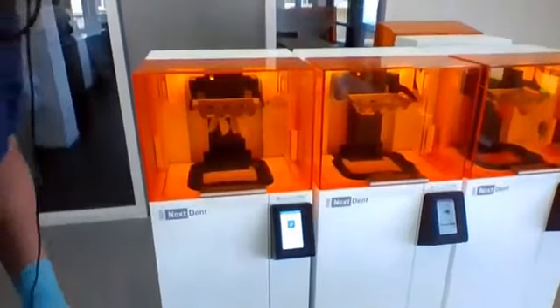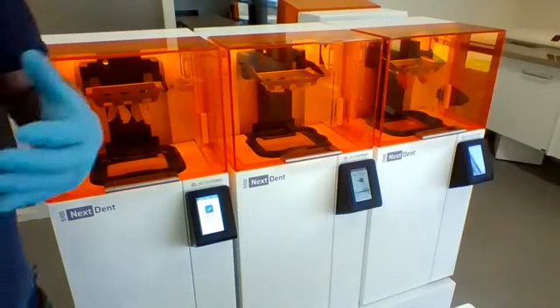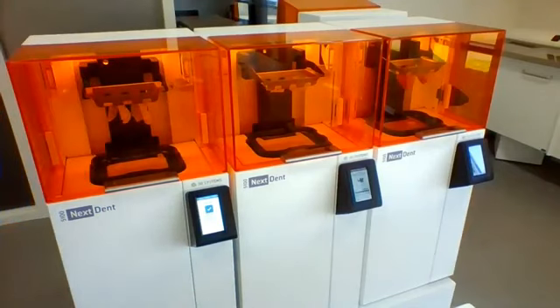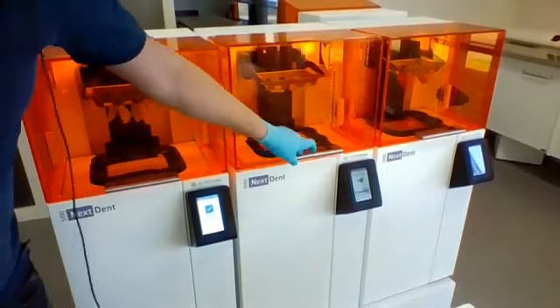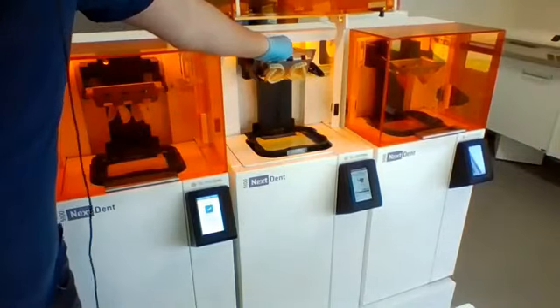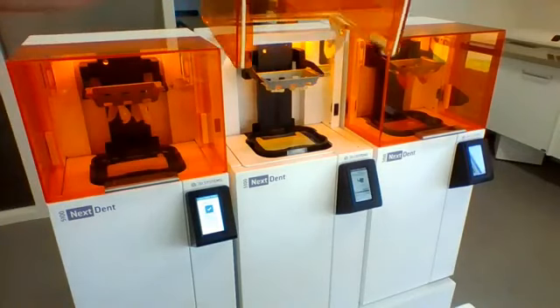Thank you. So welcome to our training center. I will quickly take you to the printers themselves. Here you can see we have set up our training center with a couple of 5100s. Everything that was created by Germen has been printed here. The first one you see the try-in, and on the second one, it's maybe difficult to see, but you see the teeth arches, and in the third printer I have printed the bases.